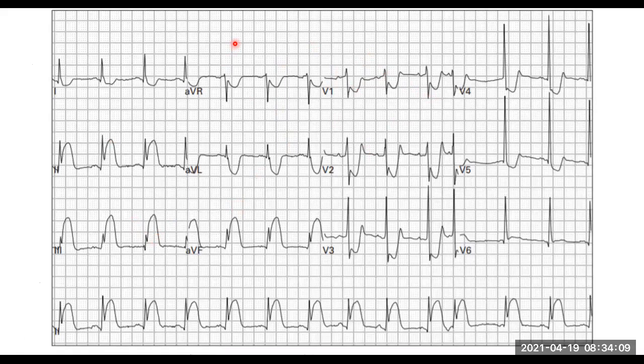Take a patient, for example, where we can barely see the ST elevations here in the inferior leads. There's hardly any ST depressions, very minor. There's no involvement of the posterior side. Are we as worried as we are with this patient? No, of course not. We still have to treat them. But this patient is somebody that we know is going to go down very quickly.